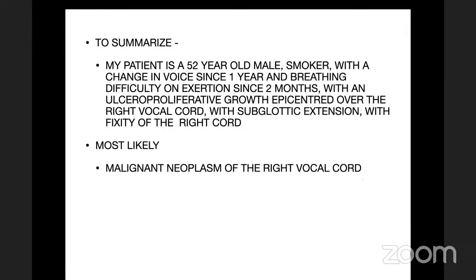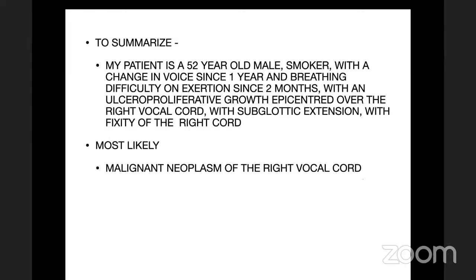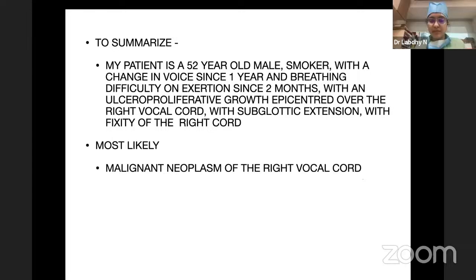Tell me the complete staging. T3 N0 clinically. Malignancy of the vocal cord. Okay, so why do you say it is T3? Because of fixity of the right cord, I would call it a T3 tumor.